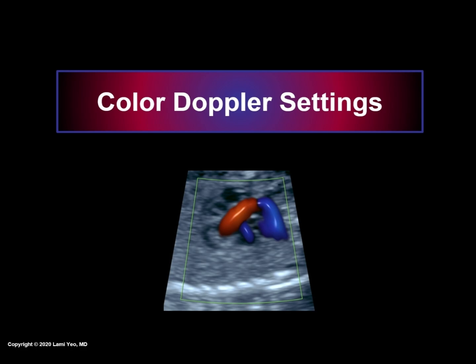Now let's review the definitions and purpose of various color Doppler settings.